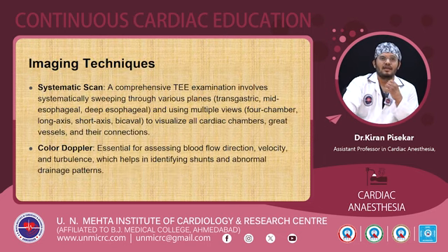Now, imaging techniques. First of all, we have to do a systematic scan. In that, we have to do a comprehensive TEE examination, which involves getting all the views. We have to systematically sweep through various planes, that is transgastric, mid esophageal, deep esophageal, deep transgastric, and upper esophageal views as well. By using the various views, we can visualize all the cardiac chambers, great vessels, and their connections.